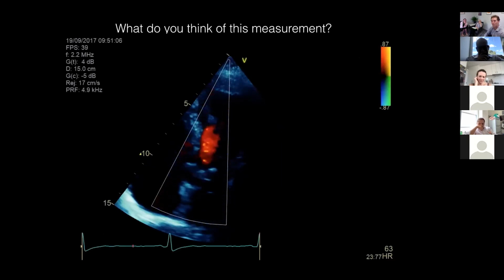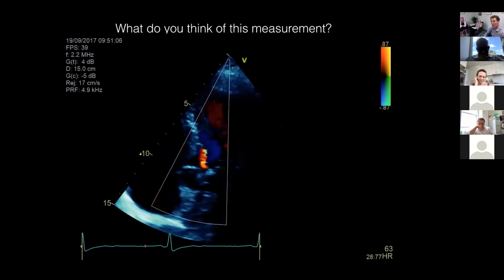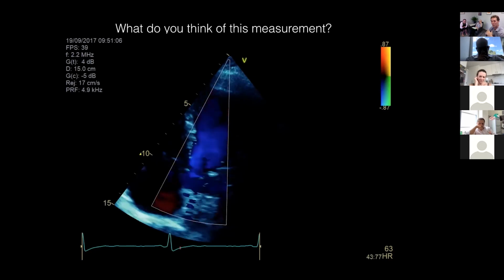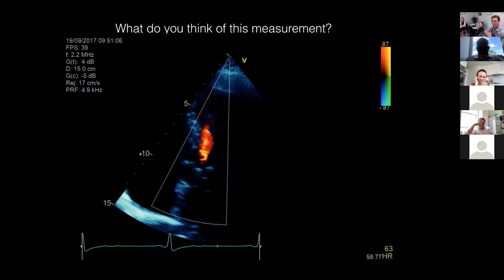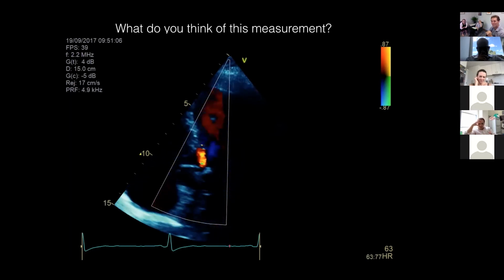Oh, and this is a great one. This is a tip and trick that I learned from Faraz when I was doing that reporting with the legends thing. It was really cool. I'm going to start trying to do these a bit more, where I call in amazing cardiologists to come and report some studies with me, because they have the most amazing little tips and tricks. And this image reminded me of something that Faraz said.